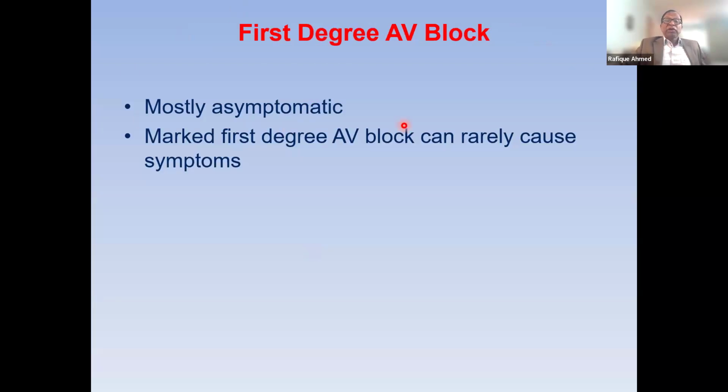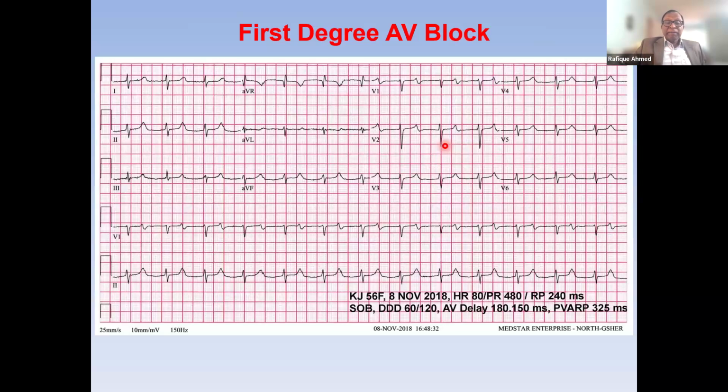First-degree AV block, mostly asymptomatic. Now, marked first-degree can rarely cause symptoms, but this is very interesting. I saw only one patient whereby one physician decided to put a pacemaker in for first-degree block, and I was kind of critical, but I looked at why he did it. So let's look at this patient.